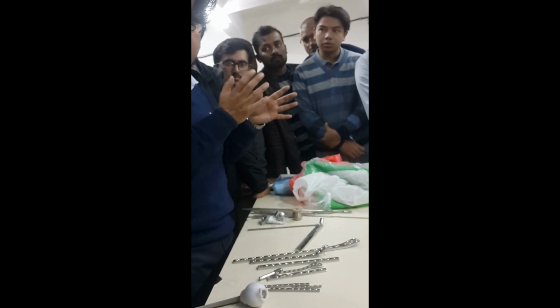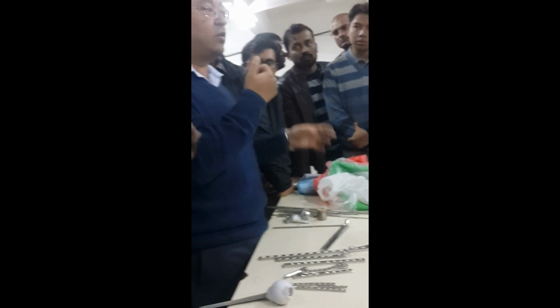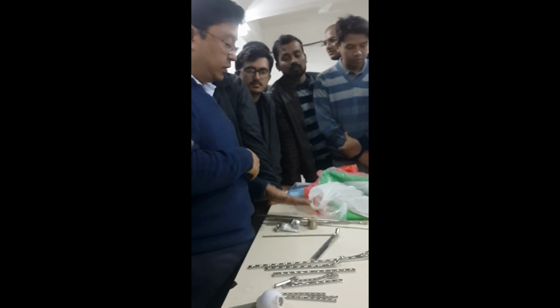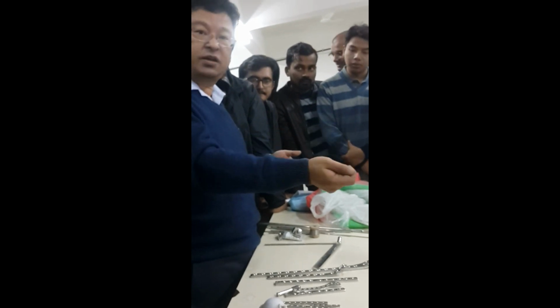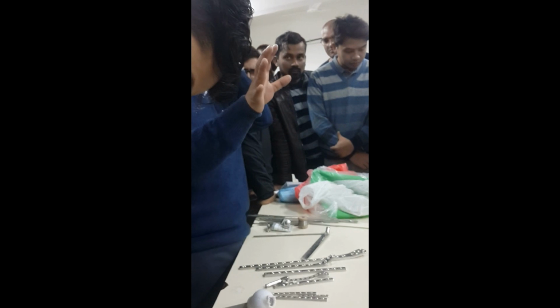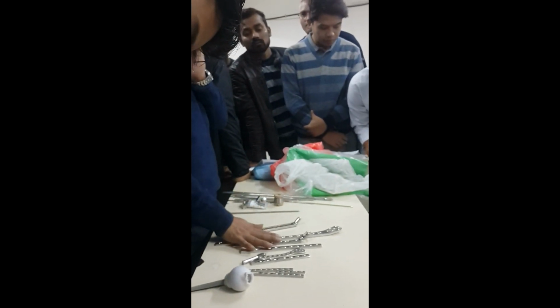Micro motion is needed for callus formation. And that is biological healing. Biological healing is better healing. So, nail has a key advantage also. You put a nail, you can ask the patient to walk 2-3 days after operation, if the patient can. But if you apply plates, you have to rest it for 6 weeks. So this is based on absolute stability.